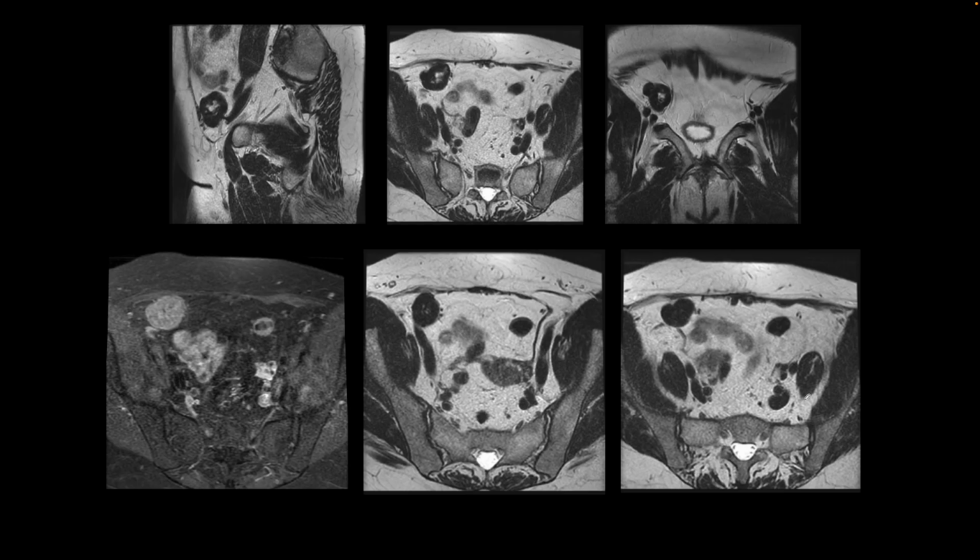So this patient underwent an MRI of the pelvis, and on the top we have T2 weighted small field of view images in all three planes. And this is the sagittal image showing low T2 signal and high internal signal. Here is the mass showing classic T2 hypointensity that we see in a fibroid. It shows contrast enhancement. We know fibroids enhance, and also paying attention to the small structures around it. It seems to be connected to this T2 hypointense fibrous cord.